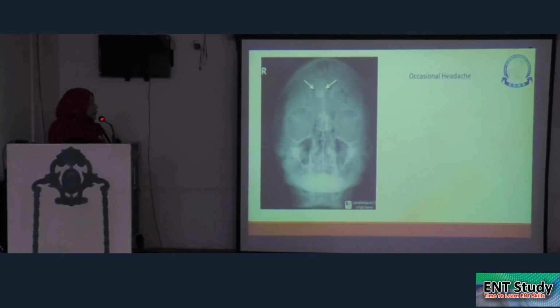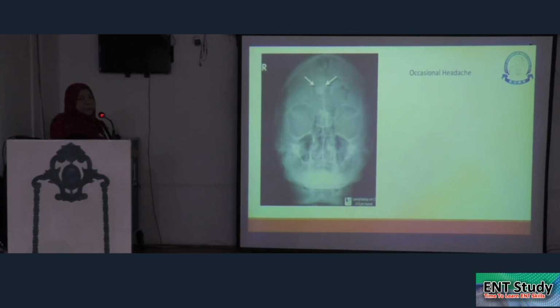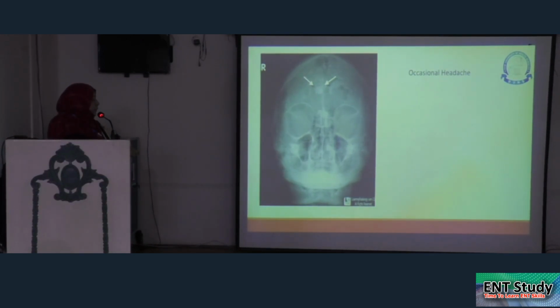X-ray of a patient with occasional headache shows a well-defined dense opacity in the right frontal sinus without any obvious bone destruction. This is an osteoma of the right frontal sinus.